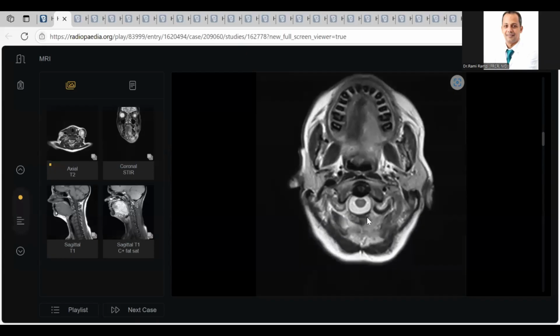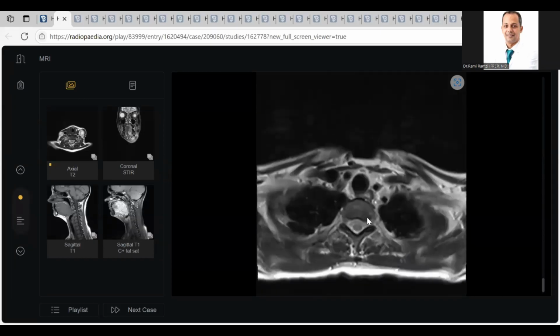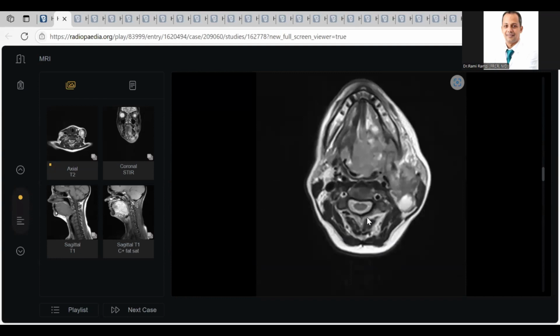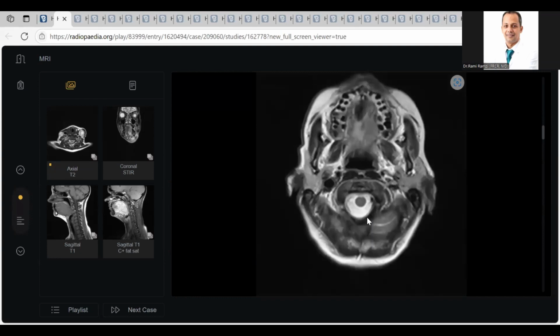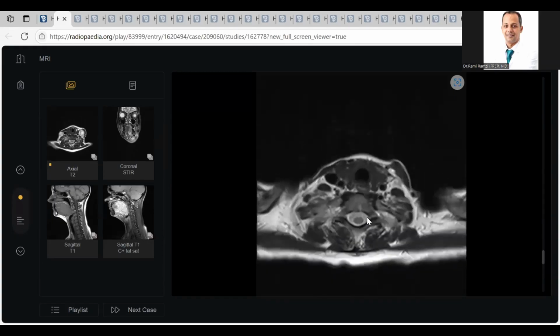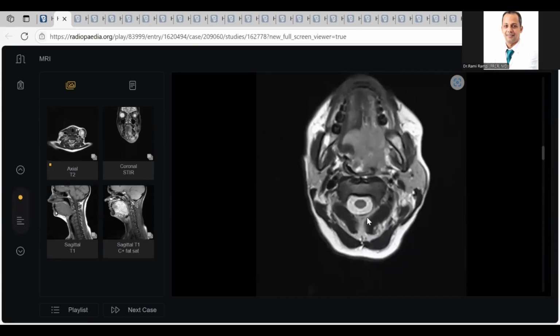The most important note from Dr. Omer's style: he takes the exam till the end. This is very important and very crucial. Sometimes the finding is on the side. See, these are cavitating lymph nodes, bilateral cervical. So I'm thinking about squamous cell carcinoma. Here, the squamous cell carcinoma is very obvious, affecting the tongue.